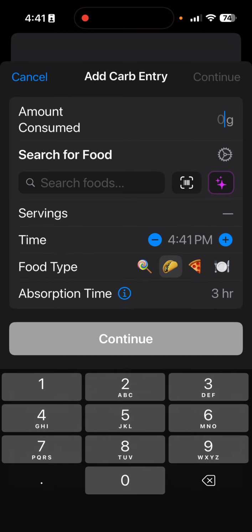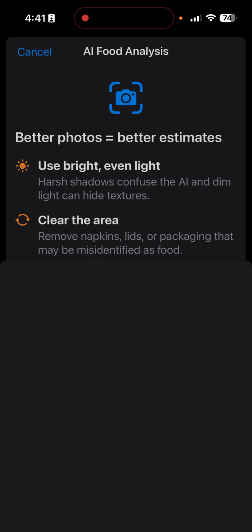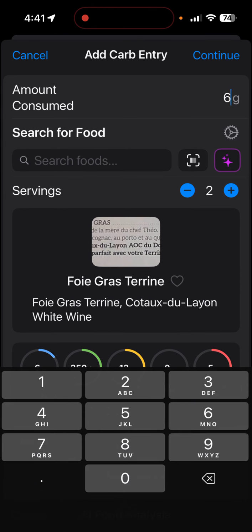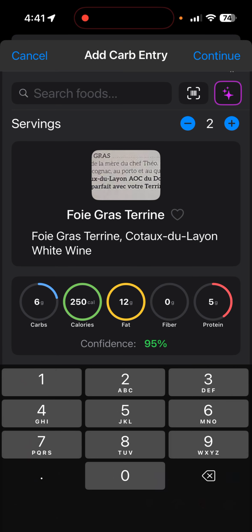because what we used to do is it would just take a picture of it and try to shove that down the AI path, and then the AI had to figure out, what am I reading? What is this? So the improvement is that it OCRs this beforehand and sends it to AI as an already translated submission. So that's pretty cool.